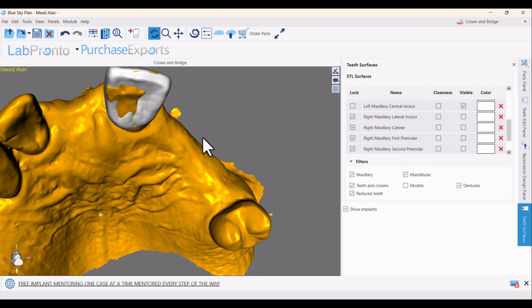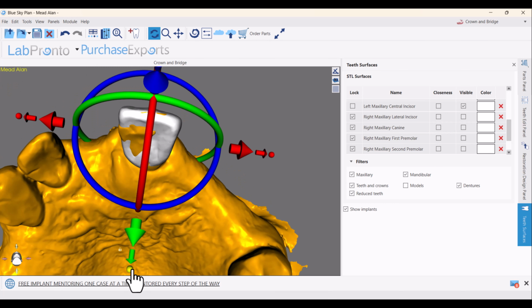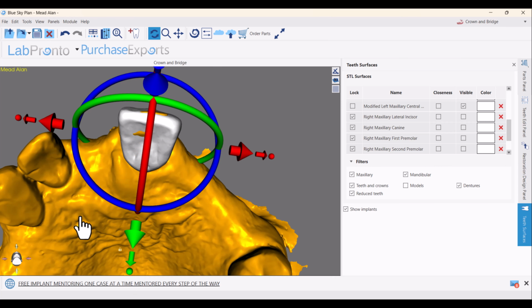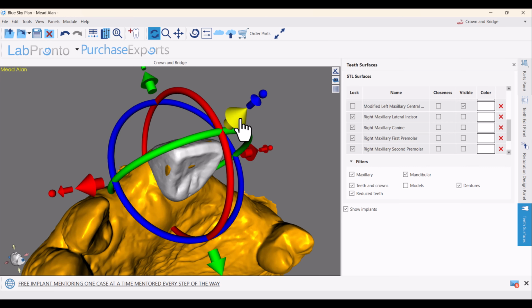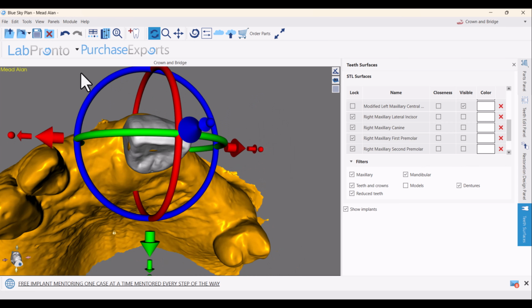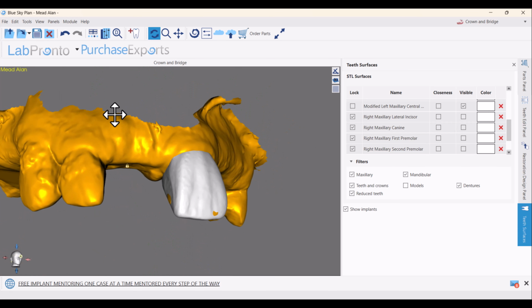Good, good, good. So we'll make this a little bit wider here. I make it a little wider, that way when Alan does injection molding here, you've got a lot more room to play with. So I think it's going to be a little easier for him just to cut back the cavities and then work back from there. Good. That looks pretty right there to me.